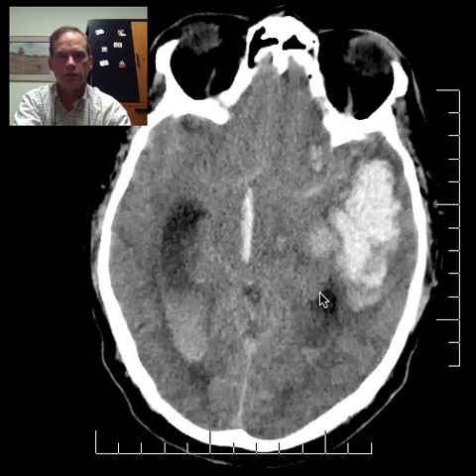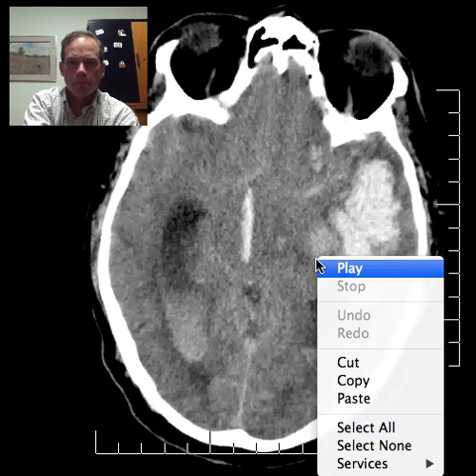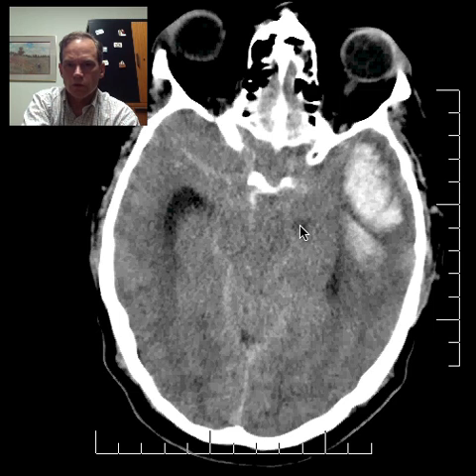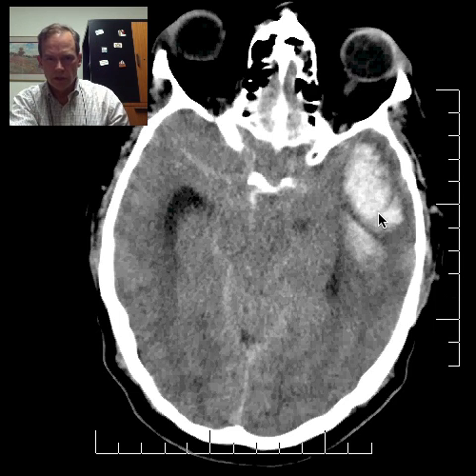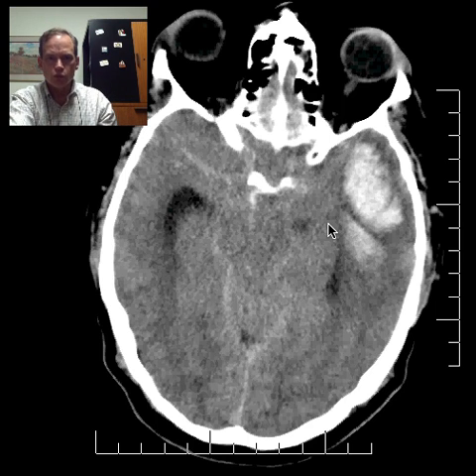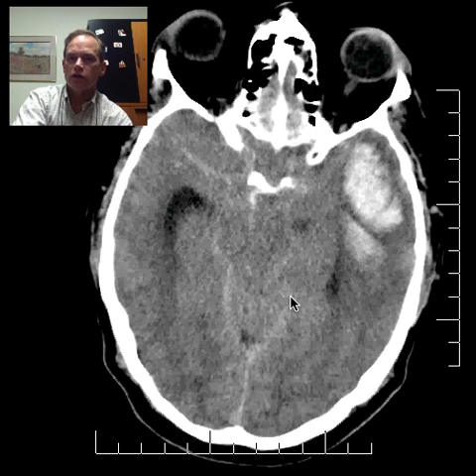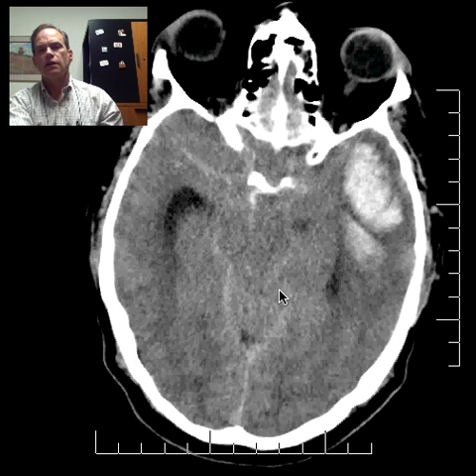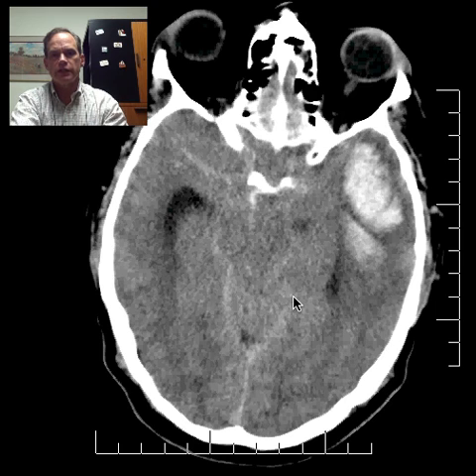Let me get down to the normal size here. It's too far medial. That's because this hemorrhage is just pushing it that way. It's pushing the cerebral hemisphere at this level, which is temporal lobe, medially. And the medial part of a portion of the temporal lobe is called the uncus, U-N-C-U-S, and it's around here.